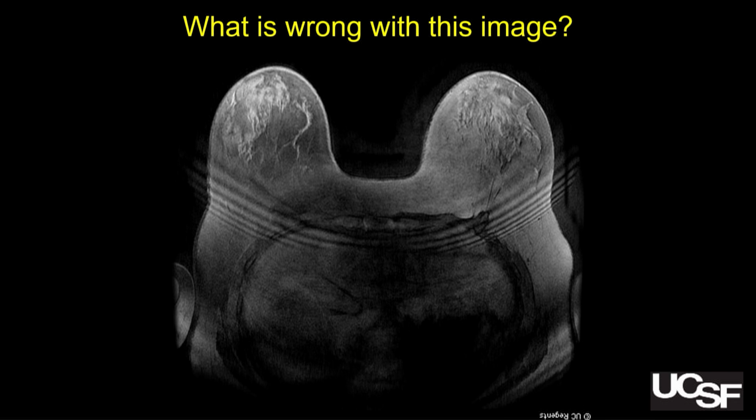So I'll tell you, I was actually troubleshooting this over the phone in transit to a different campus. So this came from our county hospital. The radiologist, who has been ingrained in artifact troubleshooting by me, called me and said, "Hey, I think something's wrong. The fat set's not good, and then there's all these parallel lines, and it's curved, and it's going front to back." So I'm thinking, aha, the phase is going the wrong way.